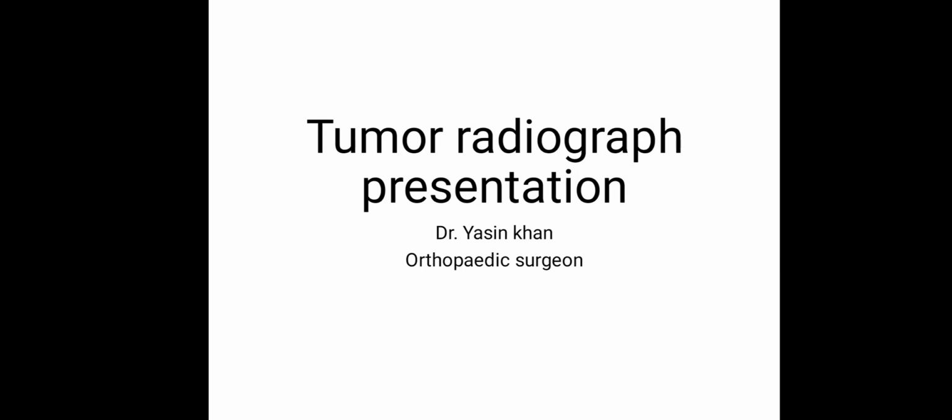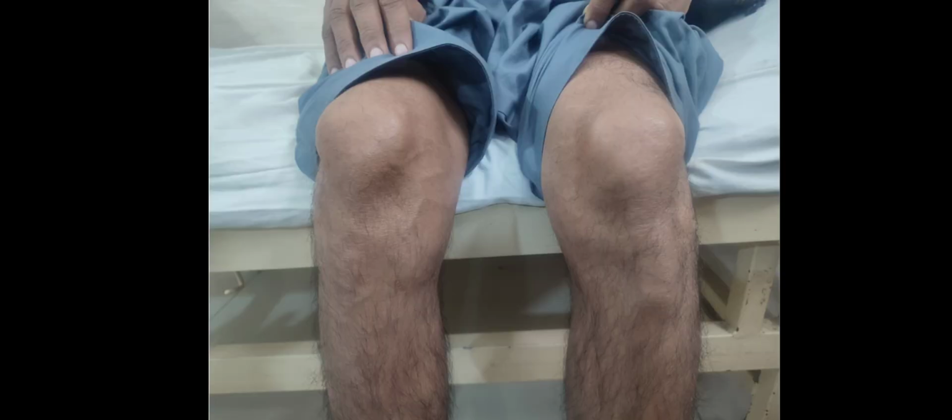This presentation is regarding how to present an X-ray with a bony lesion. This is a 33-year-old male, previously well, community ambulant, having no known comorbids, presented to us through OPD with 6 months history of progressive pain in his right knee that aggravates with walking.